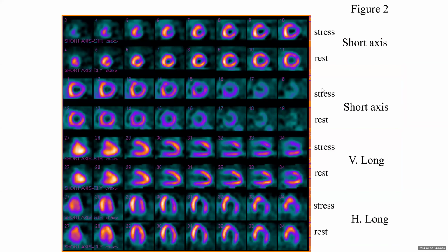Okay, these are the perfusion imaging. And you can see here, you should follow your own approach, or an approach in general, when you approach any image interpretation.